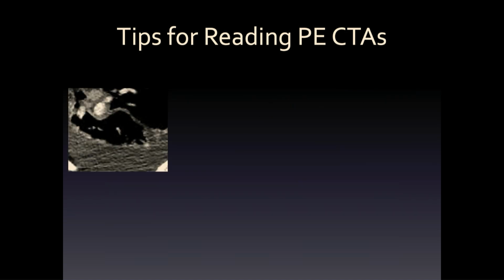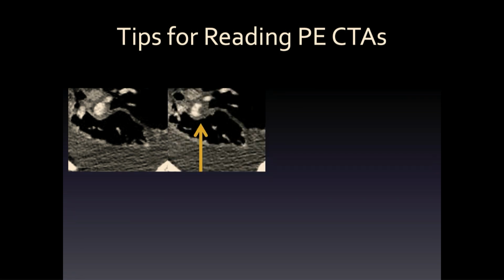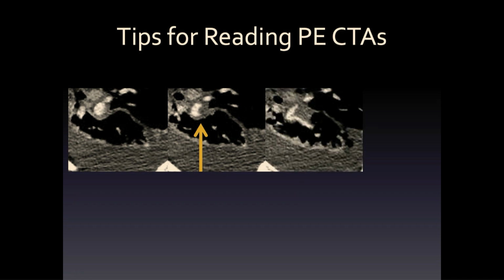And here's my other reading tip. This doesn't happen often, but I loved this. There's this terrible case. I thought maybe I had a PE because of this weird sort of rat bite out of that medium-sized vessel. But this was an inpatient, right? We had effusion, we had a bunch of stuff along the vessels, probably some edema, opacity. And that rat bite bothered me, but you give it a little bit more slices, and then it just looked like, I guess, the branching vessel there.